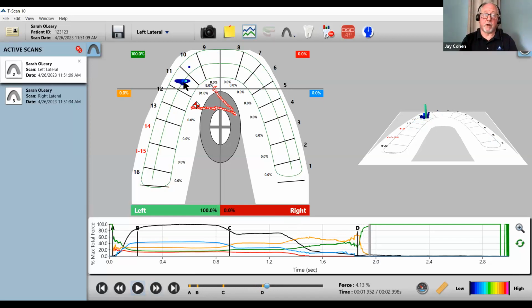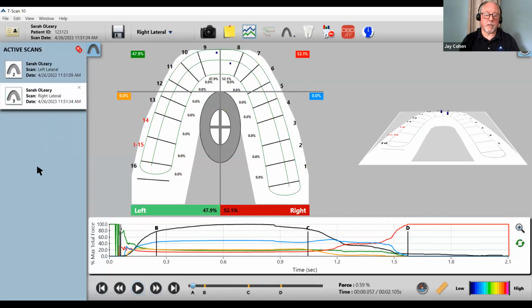Okay, so 100% on the anterior working side quadrant, 0, 0, 0. The other three quadrants have discluded. Okay, now let's look at the right side. What's the goal on the right side? Get on the red, complete all of the force, 100%. Let's follow the red line.